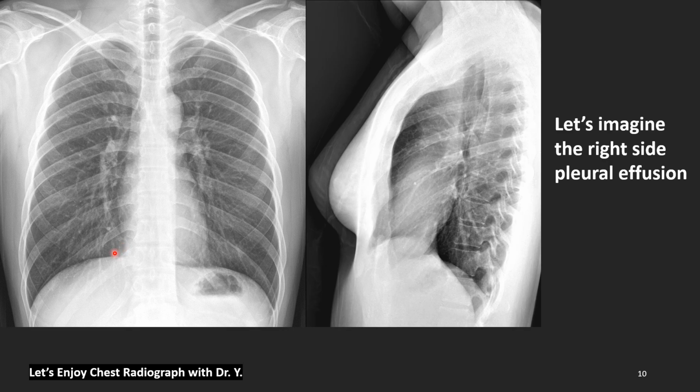Okay, like this, an obliteration of this diaphragm. This diaphragm will not appear here, and this diaphragm, left side one, will be visible only with attachment with the left side heart.